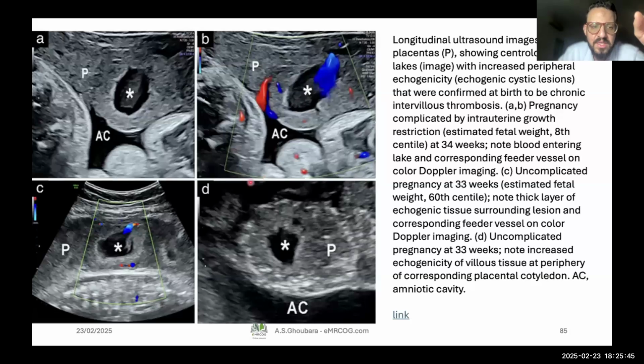By the way, this is a mature placenta. Later in gestation, we see white dots, comma-shaped dots inside the placenta due to placental calcification. It's called calcific degeneration of the placenta. That means the placenta is mature, right? We can also see it when examining the placenta by hand, visual inspection of the placenta itself. Calcific degeneration results from placental insufficiency, which is a normal physiological change of the placenta by the end of the pregnancy.